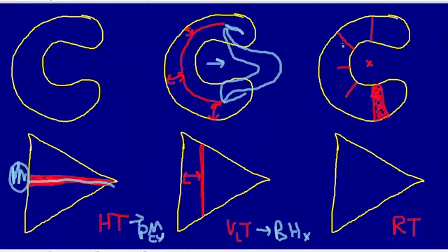A third sign to keep in mind, now I'm going to delete some of these planes, is if you have an obliquely oriented radial tear and your imaging plane is capturing it on multiple slices, one thing that you're going to encounter is that on one slice, you're going to see it almost looking like a vertical tear. And then on the very next slice, it'll also look like a vertical tear, but it'll be moving. Meaning that between slice number 1 and slice number 2, it's either going to move inward or outward. This is referred to as a marching cleft sign, and the marching cleft sign is also pathognomonic for a radial tear. It just means that you're imaging an oblique tear, like a radial oblique tear, on 2 successive slices, and it's moving in direction.